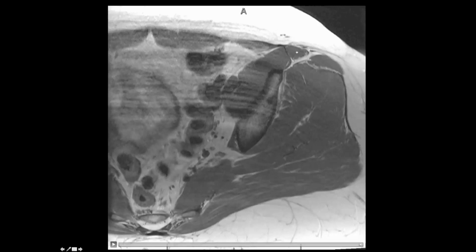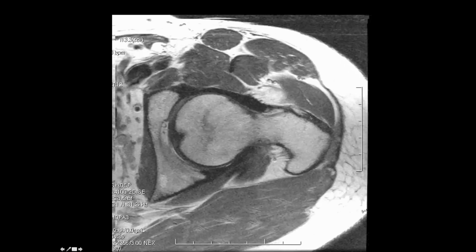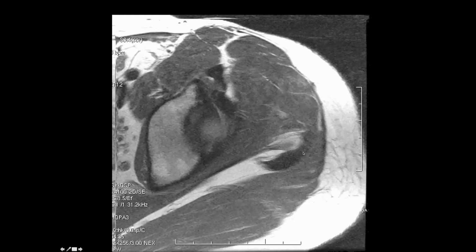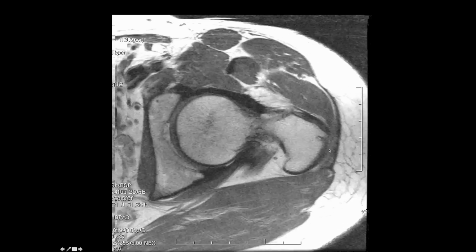This is the iliotibial band, and we see portions of the tensor fascia lata, and also in this location, arising from the anterior superior iliac spine, we see the sartorius. So as we extend distally, we see the sartorius, tensor fascia lata, iliotibial band, and we nicely see that anterior facet containing the gluteus minimus insertion, the superior posterior facet containing the gluteus medius insertion, the lateral facet containing the other portion of the gluteus medius tendon insertion, and then between the posterior and lateral facets and the iliotibial band, we see the location of the true greater trochanteric bursa.